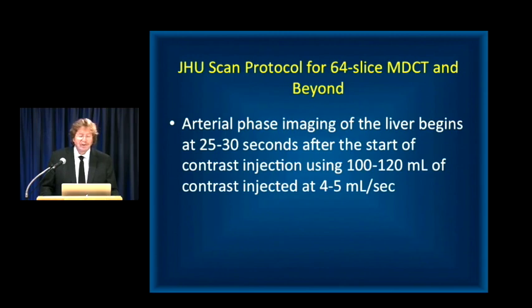If you have a patient where you're concerned about timing, then it's easy enough to do a triggering point. What I typically will do is the level near the diaphragm, use the abdominal aorta, depending on your scanner and depending on your injection rate, trigger anywhere between 200 and 250 Hounsfield units.